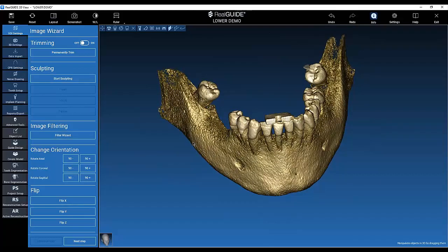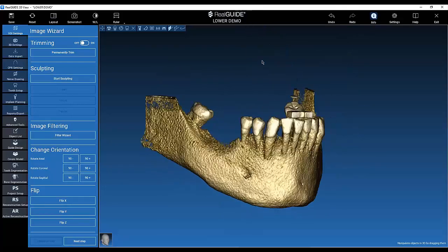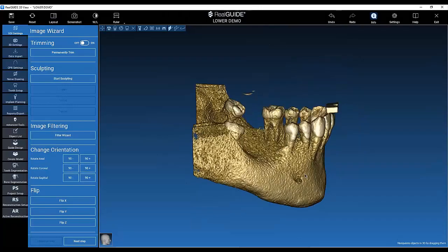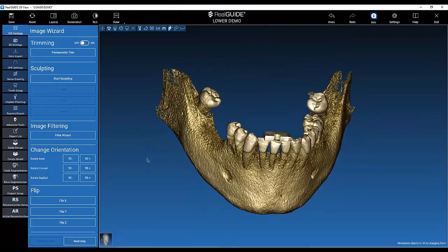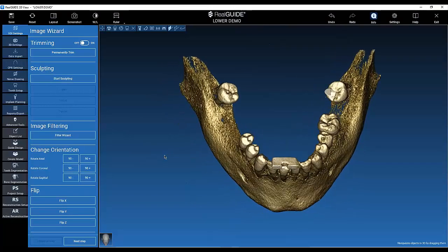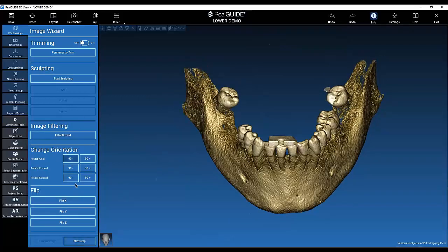I mean, when the radiologists do something wrong with the tags assignment, you know, tags upper, lower, right, and left, I don't usually use them. If there is something wrong with the DICOM, I usually call the radiologist and ask him or her for assistance. So we have this option, but I don't usually click on this part. We have finished here, so I click on next step.